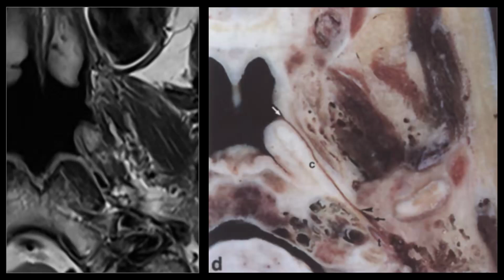Let's talk a little bit more about the Eustachian tube, because it's an important structure to know, despite the fact that we can't really see it that well, or we have to infer its location on imaging studies. I compared a magnified axial T2 weighted image at the level of the nasopharynx with a pathological specimen. And I think on both we can clearly recognize the Torus Tubarius and the nasopharynx.